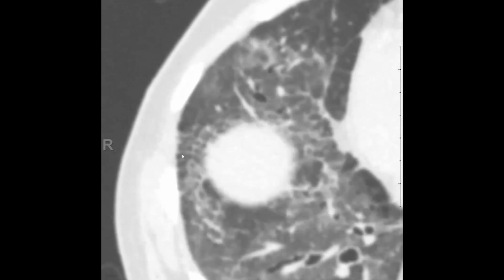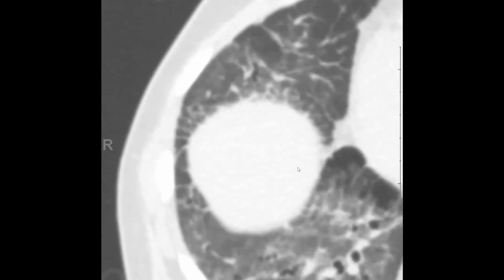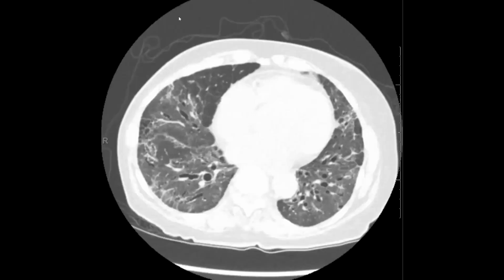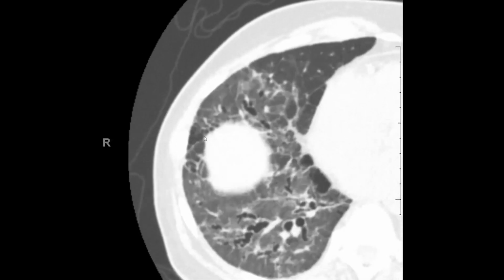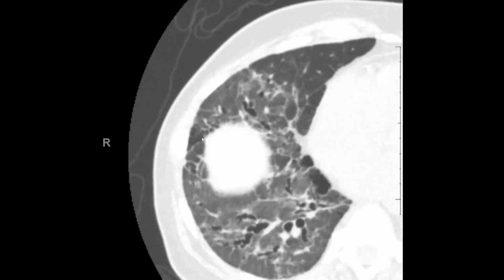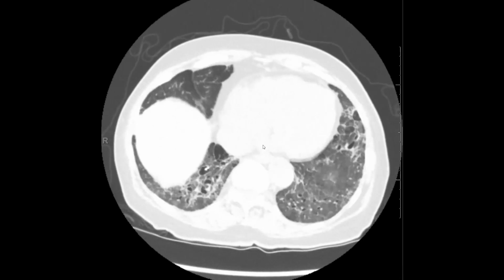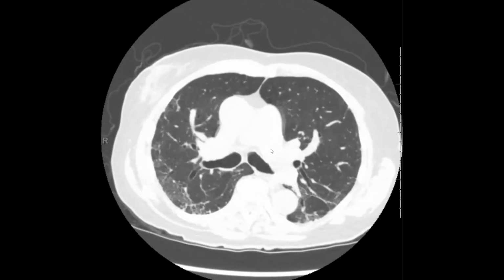For example, here in the right middle lobe. So I will say that some of this is probably just reticulation, but the subpleural stuff, the most peripheral stuff, that does look like it could be cystic. And so this could be very early honeycombing. And indeed, if we do look at the CT performed 4 years after that, we see that, again, those areas of peripheral lung reticulation that mimic honeycombing now look like pretty obvious subpleural honeycombing. Again, note the exuberant traction bronchiectasis that we commonly see in patients with NSIP.